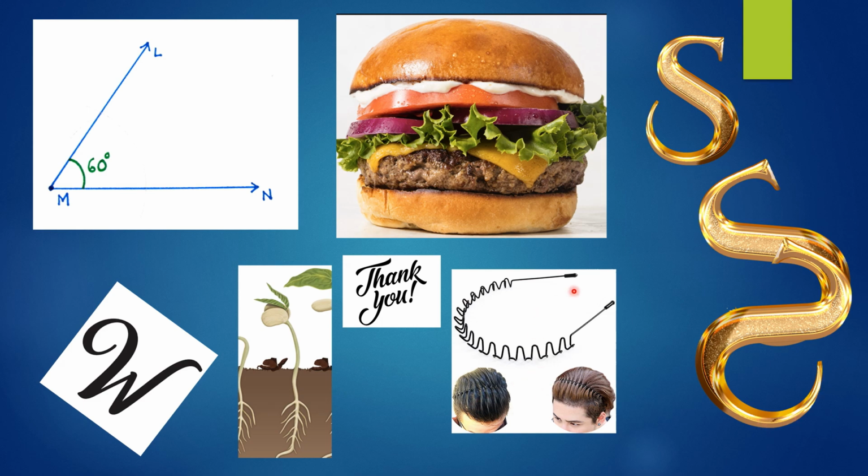Then we saw the headband, which is basically the fornix, fimbria of the hippocampus, and the mammillary body. Then we saw these two structures. Anteriorly, we had the W-shaped part of the hypothalamus, which is basically the optic chiasma, anterior commissure, lamina terminalis, median eminence, infundibular stalk, pituitary gland, tuber cinereum, and the mammillary body. Then posteriorly, we saw the germinating seed appearance, which had the pineal gland, posterior commissure, and habenular commissure.